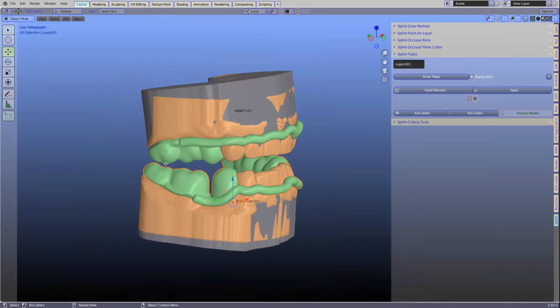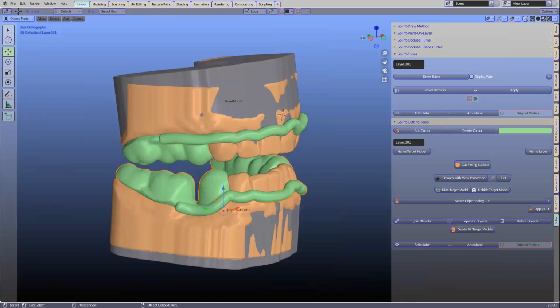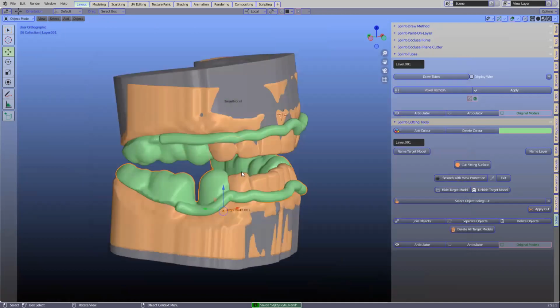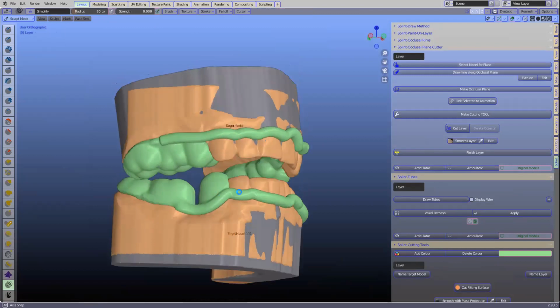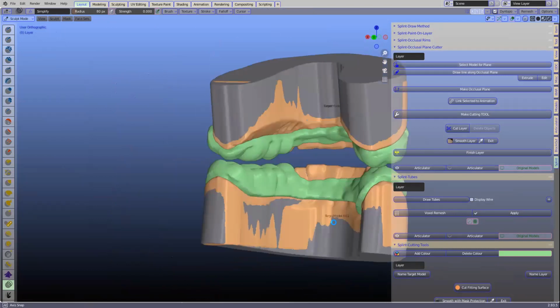Now the thing is, I do want to smooth it down because at this stage it doesn't look that good. What I'm going to do is look for a smoothing tool. But first of all, I'm going to save my file. I've got a lot of files that look like that, just like random chaos on a piano. Okay, so let's smooth this. I'll find myself a smoothing tool, smooth, and we're going to give it a quick smooth. It's very important to have clean, nice meshes when you're working.